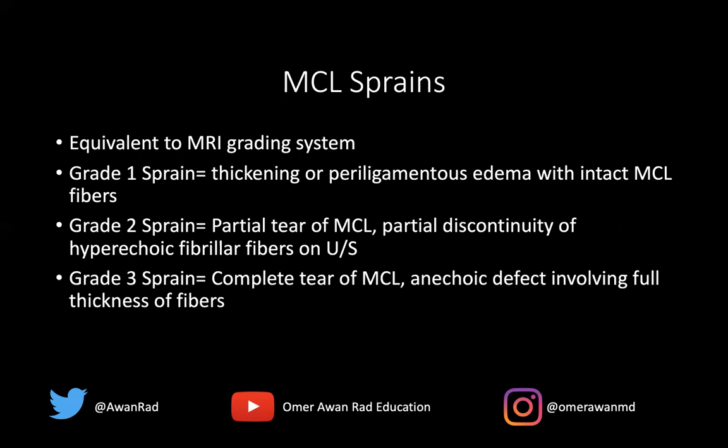And again, we don't typically diagnose meniscal tears. That was a distractor in this question. We typically rely on an MRI to see the extent of the entire meniscus. Okay, so a nice review of what MCL sprains look like and how this can be applied to ultrasonography, which is just as good at diagnosing MCL sprains, whether grade 1, grade 2, or grade 3, as MRI.